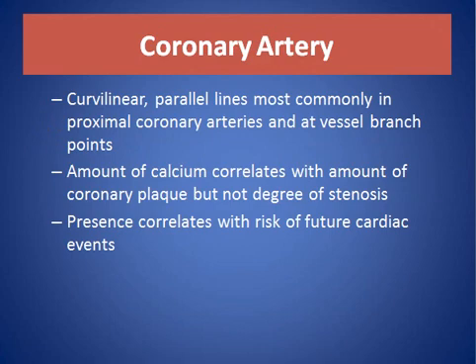Coronary artery calcification appears as curvilinear parallel lines, most commonly in the proximal coronary arteries and at the vessel branch point. The amount of calcium correlates with the amount of coronary plaque, but not the degree of stenosis. Its presence correlates with the risk of future cardiac events.